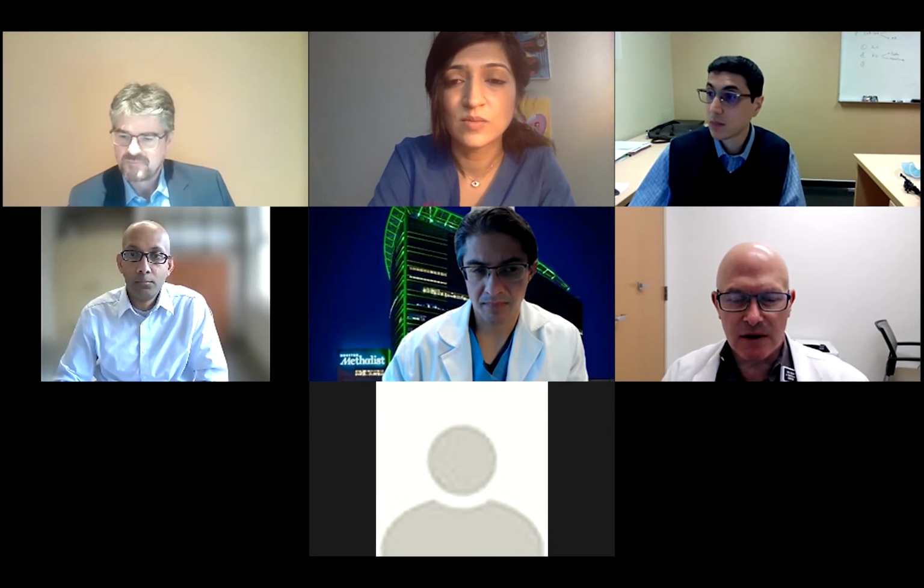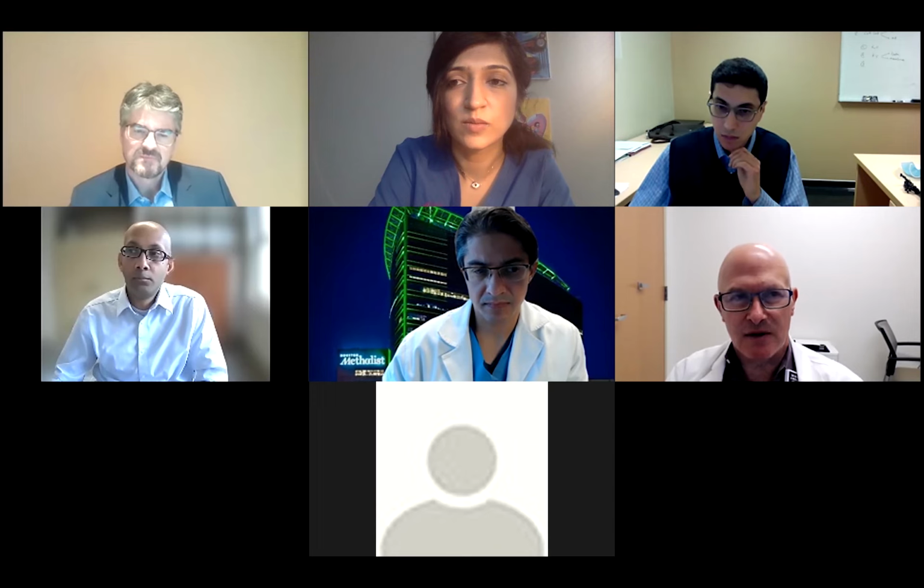No, sometimes it is difficult. In general, it's 1 pixel wide, a very narrow band. Occasionally it can look a little broader than that, but it generally is, often the entire circumference of the LV, although it can be commonly in the septum, more commonly than other locations in my experience. But generally only 1 pixel wide. It'll be there before peak perfusion in the myocardium, and it can be a difficult differential though. But I think with more experience, you get used to seeing these dark rim artifacts.